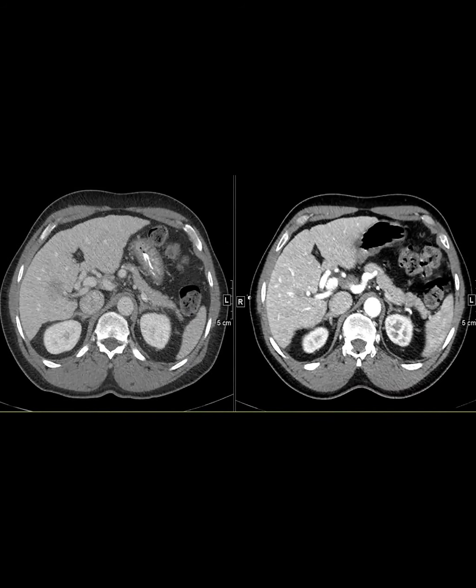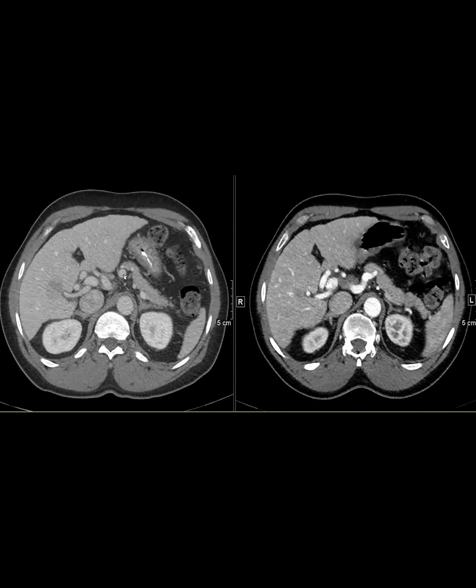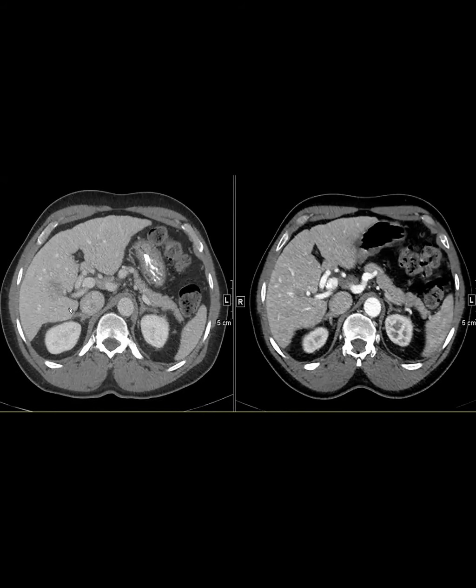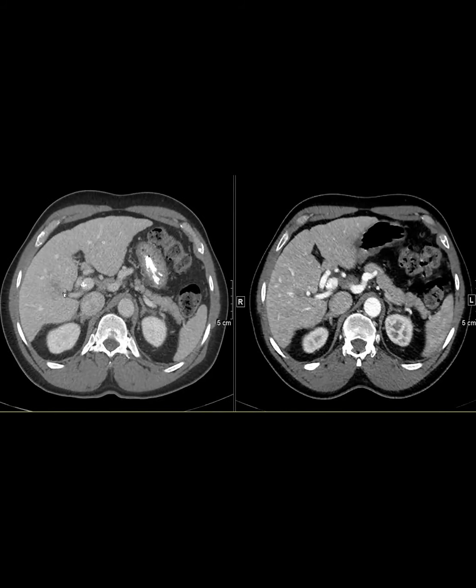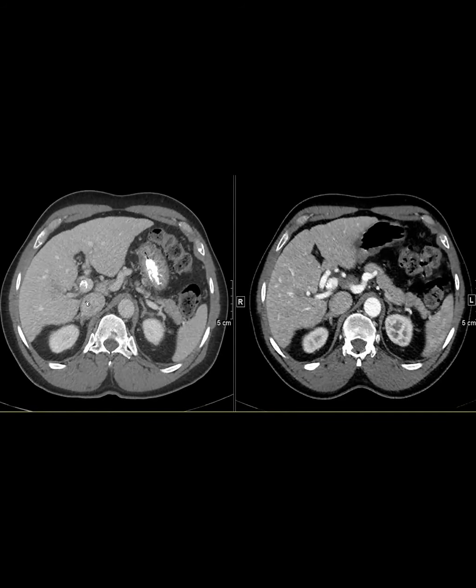So whenever you see something new or worse in advanced cirrhosis, focal fat is probably not a great choice. If I was reading this de novo, I probably would have called it LR3, which would make it a 3 months follow-up. I may have bumped it up to 4 because of the subthreshold growth. But at least it has to be 3 or 4.